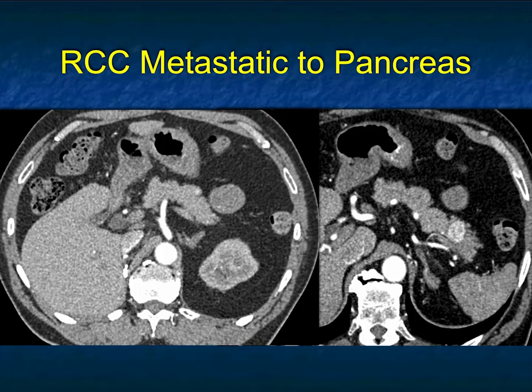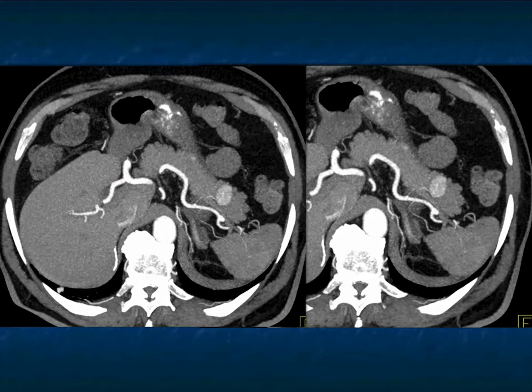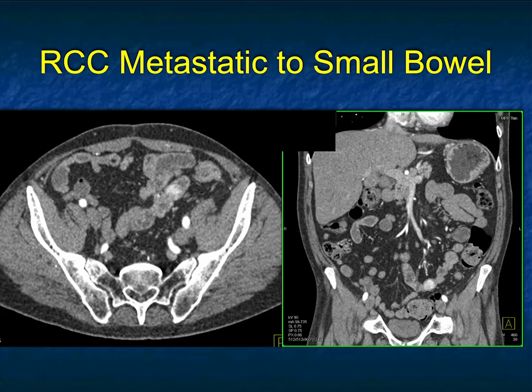Or another patient, again, multiple lesions in the pancreas. Here's a 5 millimeter and maybe a 15 millimeter, right nephrectomy, right adrenalectomy. But again, you have the pancreas. And then as we scan downward, we're going to look for any other potential lesions. And again, this patient had metastasis to small bowel here and here, similar to the last case. Again, as I mentioned, small bowel metastasis.